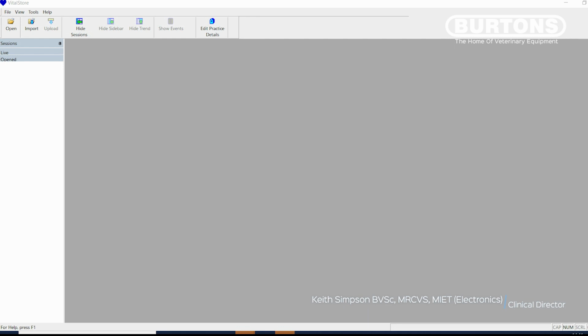The VitalStore Software Program is concerned with reviewing, editing and printing data from your pre-recorded sessions that have been recorded using the Vital Monitor program. When looked at on the desktop, your Vital Monitor program is indicated by a red heart, and the VitalStore program, that is this one, is indicated by the blue heart. Simply double clicking on that blue heart icon will bring you straight into this normal open blank screen.